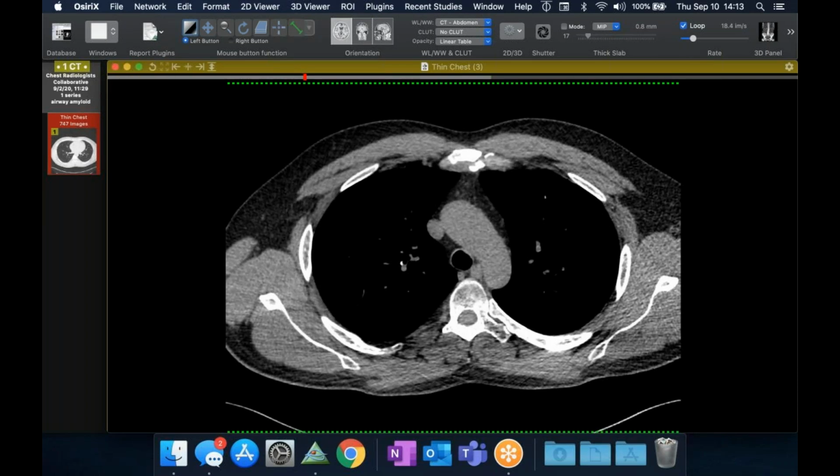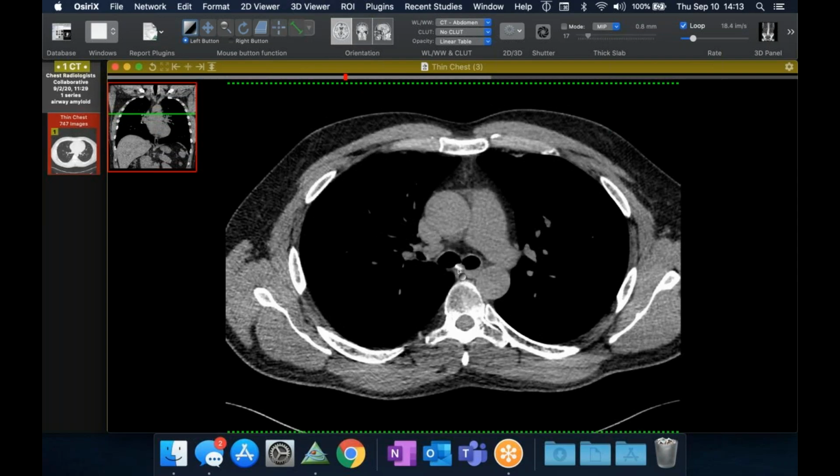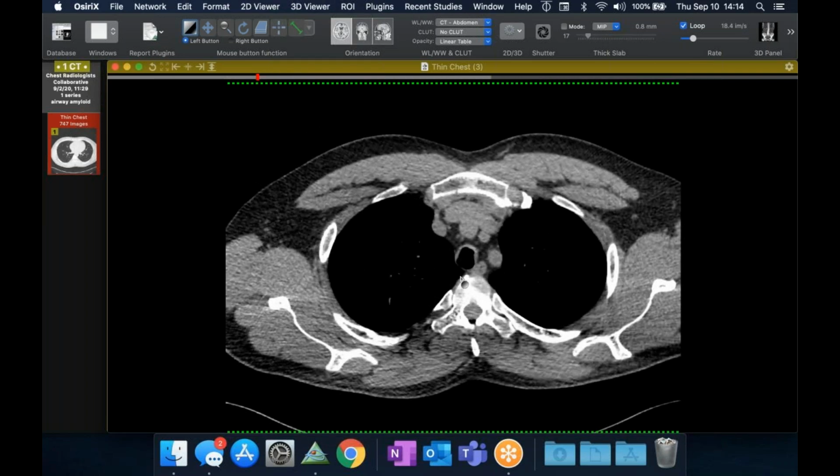Yeah, I would have thought relapsing polychondritis just on the top slices. Yeah. And right, then, yeah, no, down there it's clearly not. You know, it's interesting. We see those cases where you have a lot of kind of bronchial, more distal bronchial involvement with those kind of nodules that stud the third, fourth, fifth order airways. I think, and I've only seen 5-6 cases of those. Those I see tend not to have the tracheal involvement. Do you? I've only seen one that went out far and it didn't have tracheal involvement, but right.